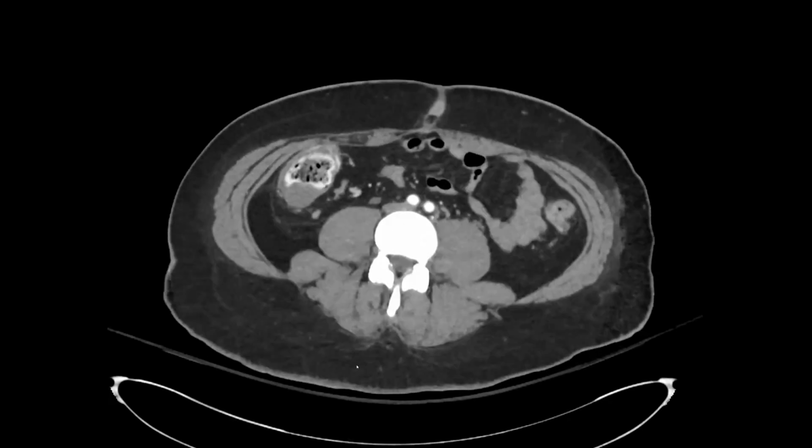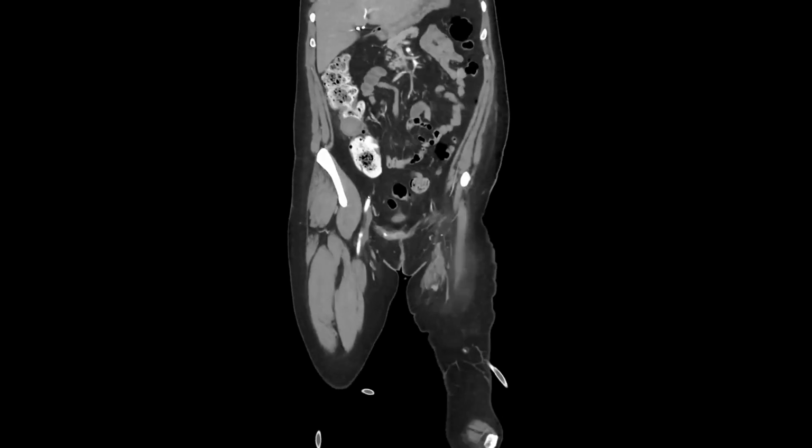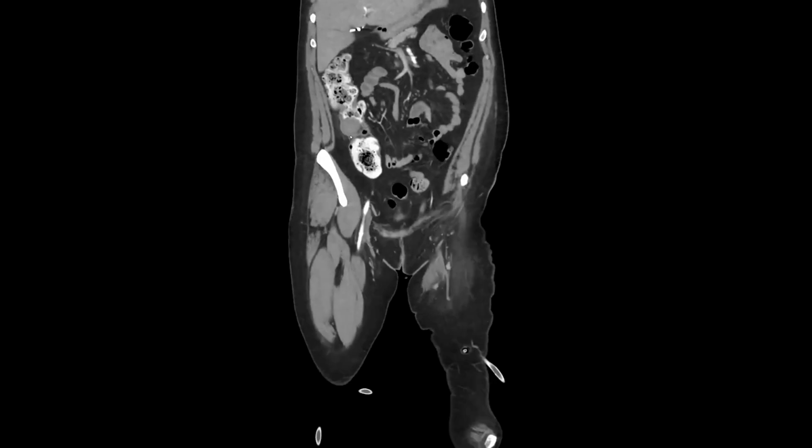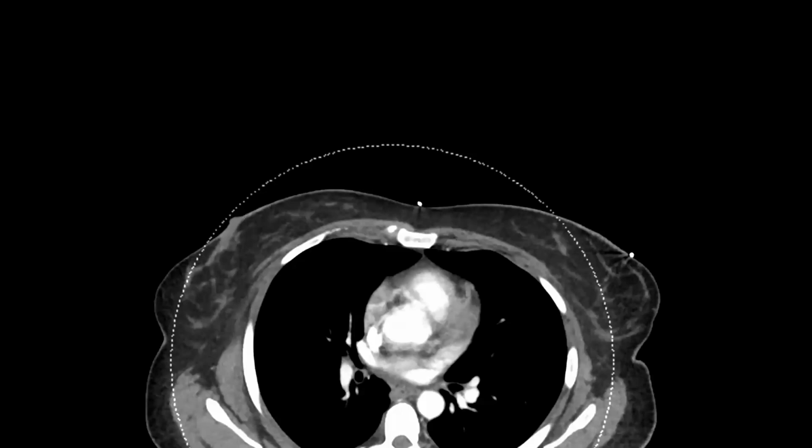Hello? Aarti, can you show coronals? Yeah. Okay, there it is on the coronal. I'm not going to try to move this because it will mess it up. It looks like an exophytic mass from the... Yeah, right? It doesn't really look like a typical mucosal based adenocarcinoma. It looks either submucosal or possibly serosal, like you're saying, exophytic to the colon.